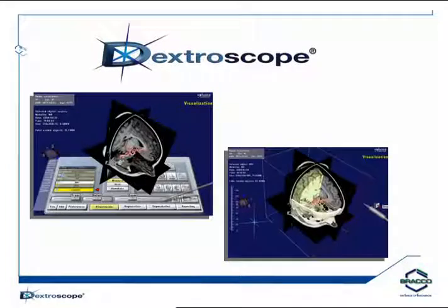And when you touch down, and you'll see when Dr. Sarah operates the Dextro Beam, which is a projection device, when you touch down on the base, you get this virtual keyboard or a control panel, and with the stylus, you're able to touch buttons, virtual buttons and sliders, and manipulate the image any way you want to.